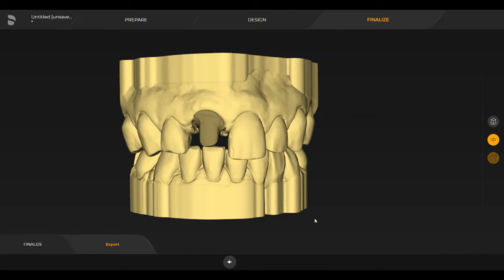I'll show you kind of what they're going to have to do when it gets to the Army Dental Lab, but you yourself don't have to do this step. But what you need to give them is a couple pieces of information to make it easier. First, you need to click on Single File.